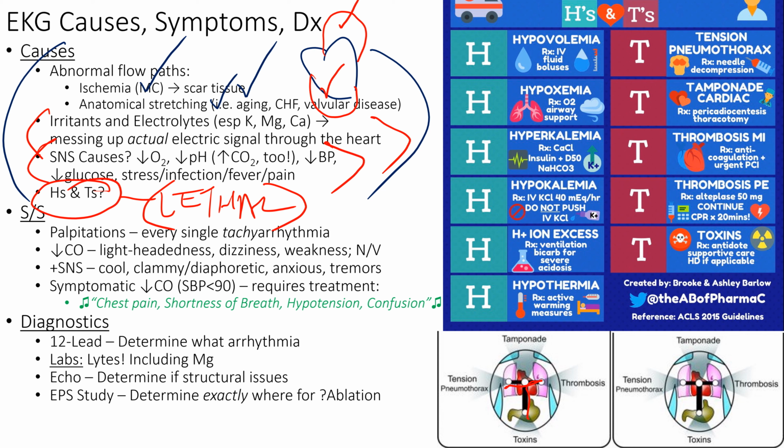So this is a nice T right here and kind of almost an H. That's also a T. But anyways, I thought there was an H there somewhere. That's my fault. So let's find out where the H went. There's a picture somewhere about an H. Either way, we got low volume circulating around. Our blood pressure is low. That's going to make us have VTAC if we have a sick heart, or we might have a sinus tac if we have an okay heart, right?